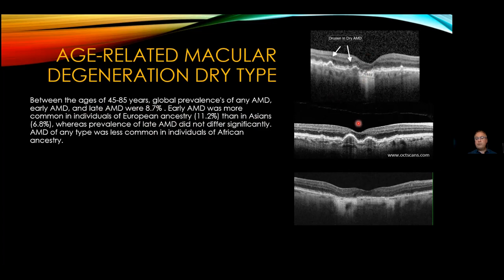So again, we've got 3 OCTs here. So the top one, we can see that there's some drusen. So that is these elevated areas of fatty deposits that are underneath the retina there. This is atrophy. All of the retinal pigment epithelium and photoreceptors are gone there, and that's why with the OCT we have these white marks, and that's called hyperreflectivity.